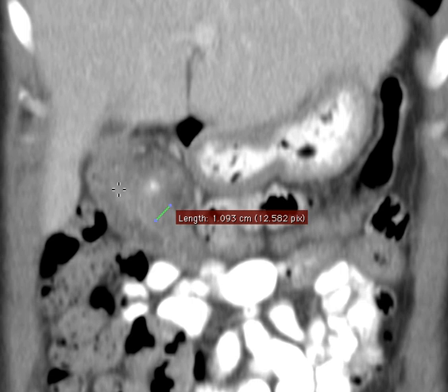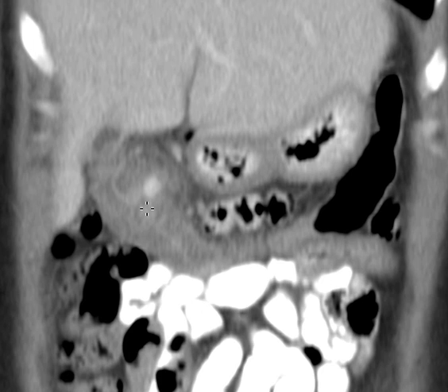The lumen of the colon at this point appears effaced. The lumen would be right in here, along there, and it's just effaced, meaning closed by virtue of the surrounding walls kind of closing in on it.